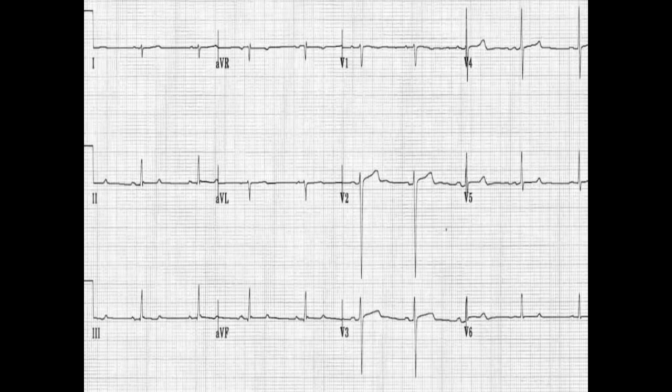That's awesome, but we need to rule out right atrial enlargement and right ventricular hypertrophy, and we haven't gotten there quite yet. We will in a week or two, a few more lectures, but we don't have right atrial enlargement. We don't have right ventricular hypertrophy. For the time being, you're just going to have to take my word for it. So here we do have a left posterior hemiblock.